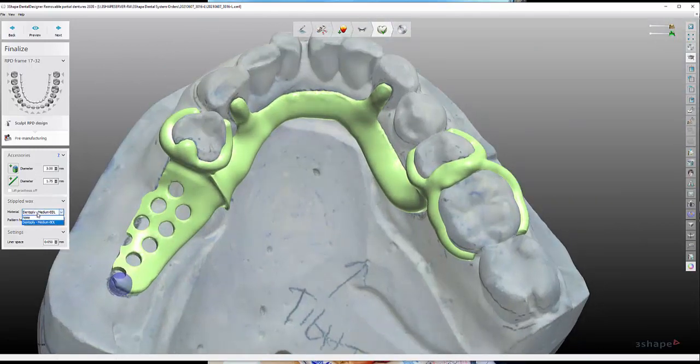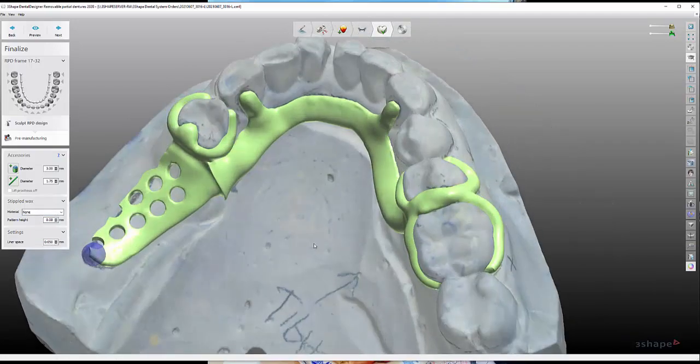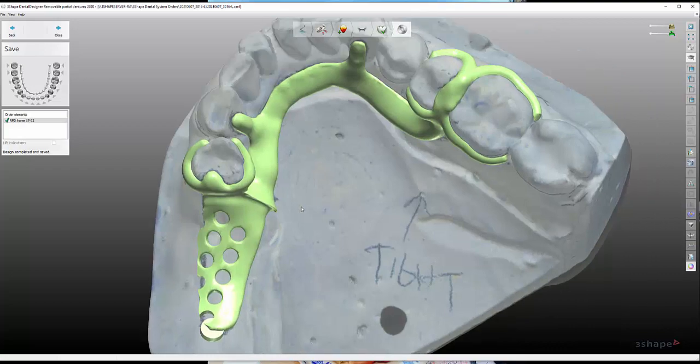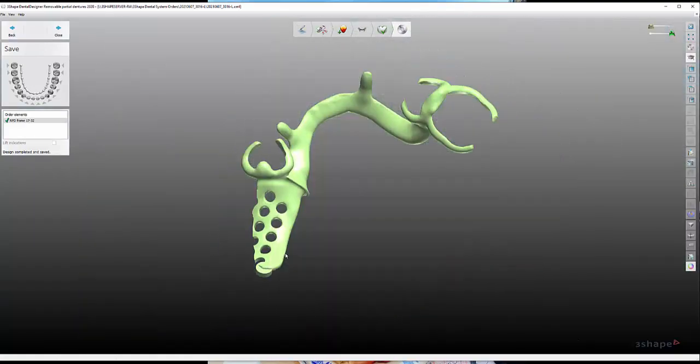And with this being lower, there's no stipple. And our default, we always want to do this 0.050 for our line spacer. That's for our spacing when we're manufacturing. And next. And that's it. Just make sure that this tissue stop looks fully connected. Sometimes we have issues with that.